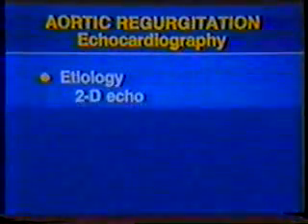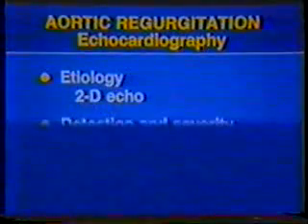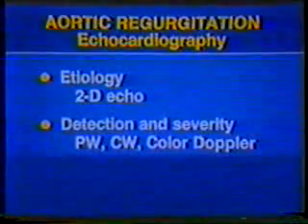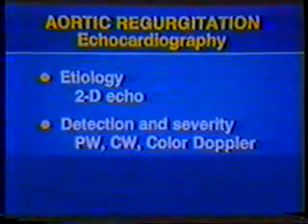Aortic regurgitation results from various etiologies, which can be determined from 2D echo evaluation of the aortic valve and aortic root. The detection and evaluation of the hemodynamic severity of the regurgitation is assessed by a combination of pulsed, continuous, and color flow Doppler techniques.